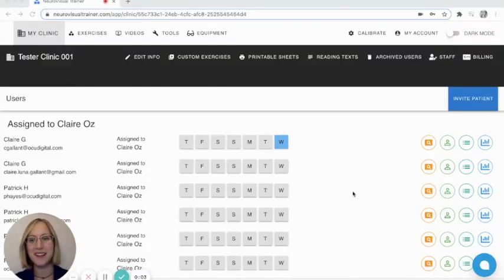My name is Claire, and this is your first video as an intro to NeuroVisual Trainer. Just having a quick look around the app. If you want to pop your app open and follow along, it's actually a great way to get started.